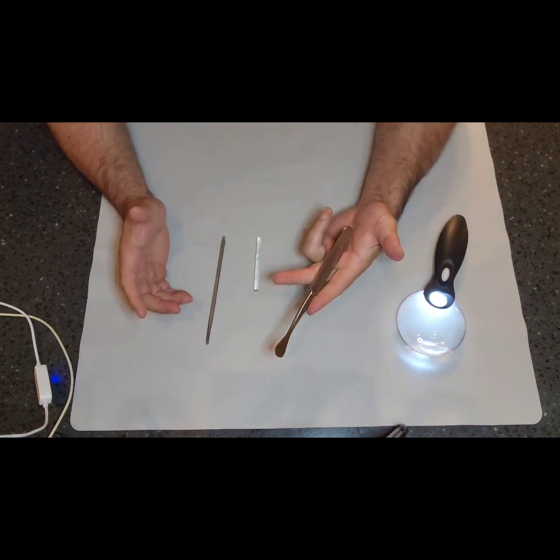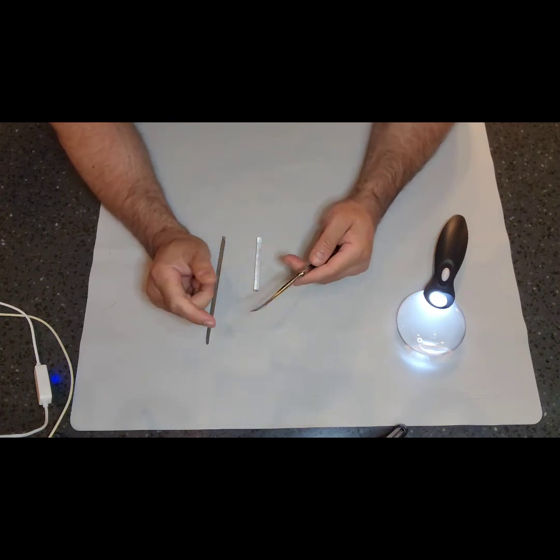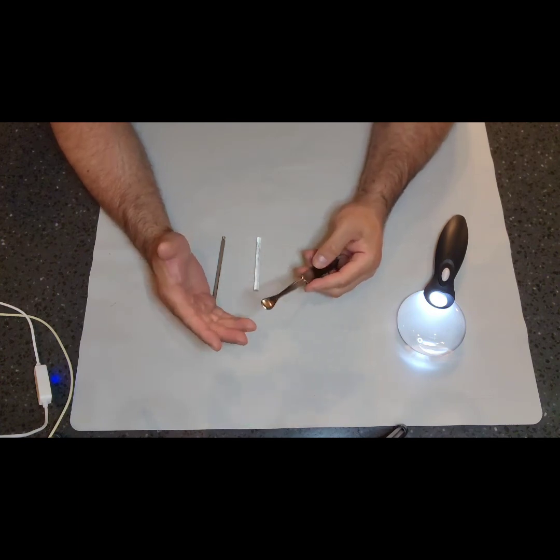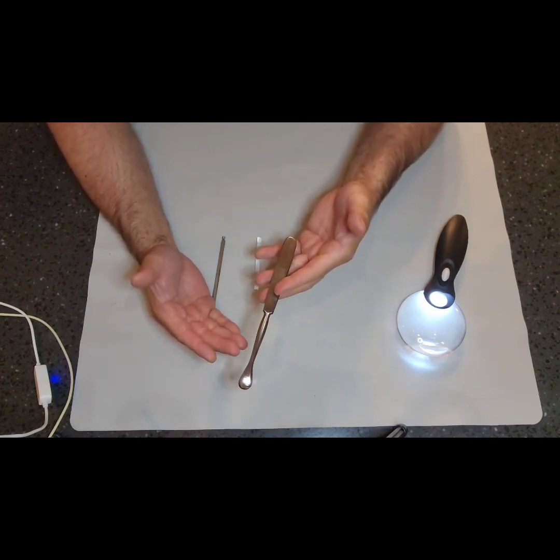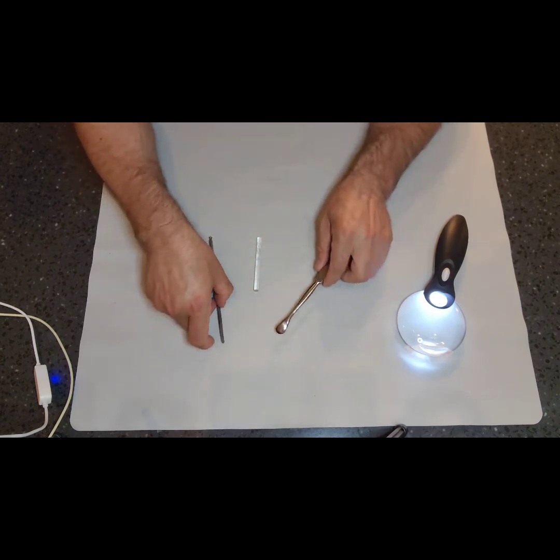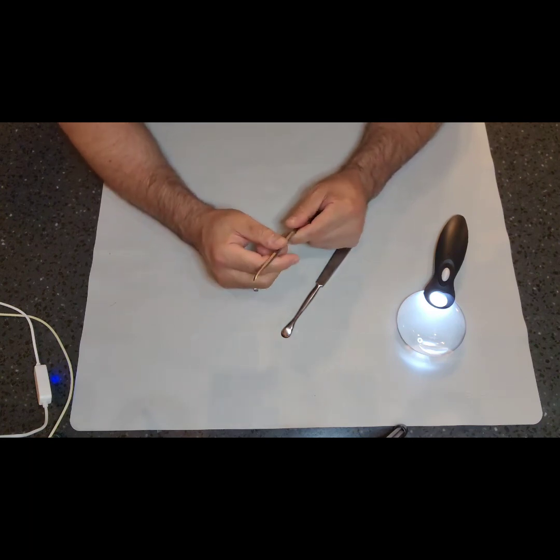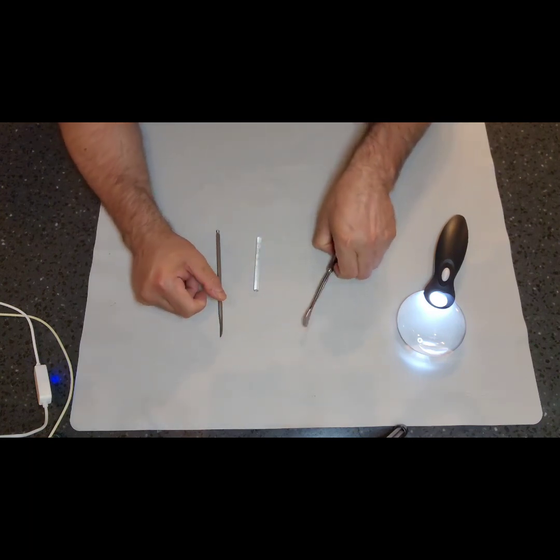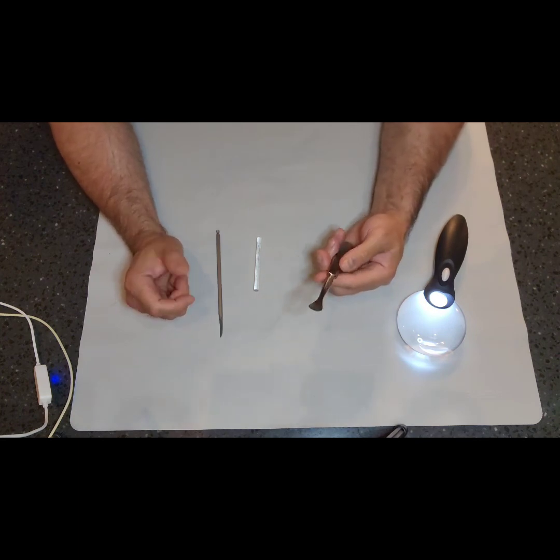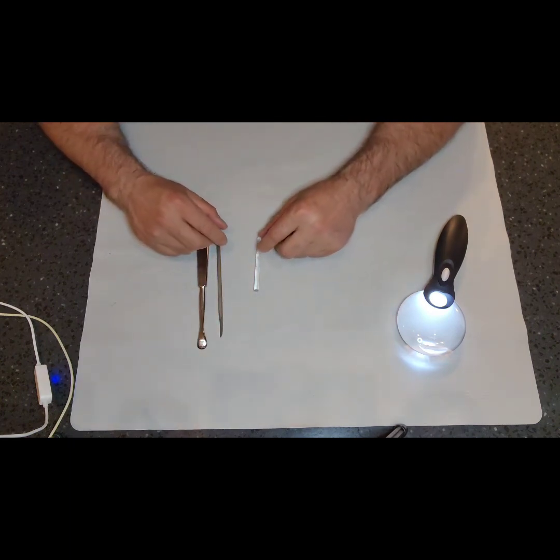Again, when you package these, with some of them, depending on the policy in your hospital, you may need to put a tip protector on there so it doesn't flay around in there. If you're using the sterilization bags, you should put them in the sterilization bags. And again, protect the end user, because some of these are pretty sharp. You don't want the end user getting cut. So tip protectors are good. If you're placing these in sets, there's usually more than one of them. Keep them together.